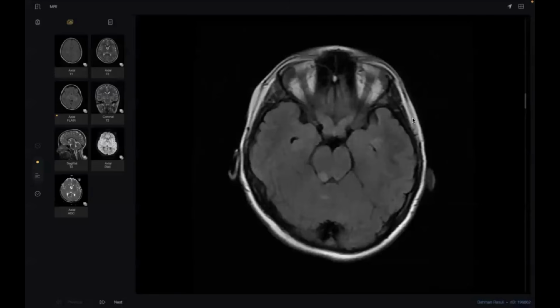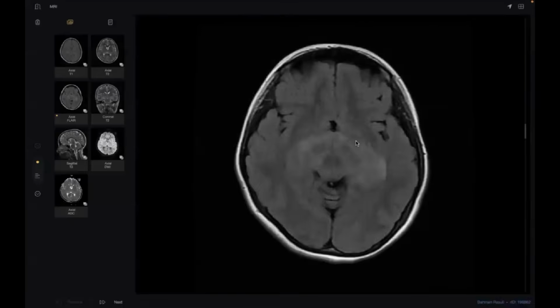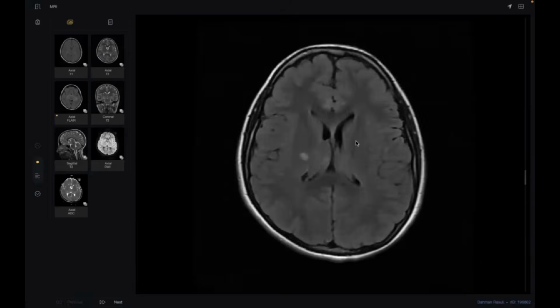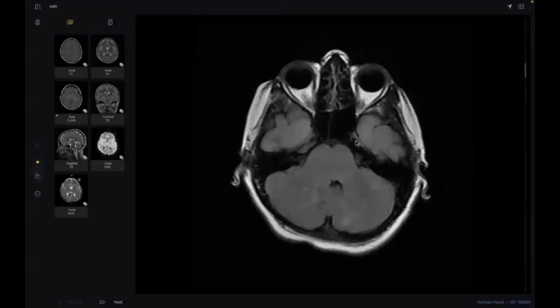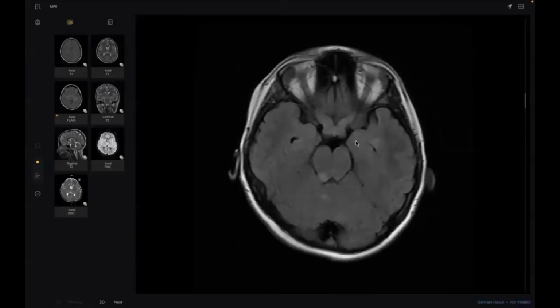These are multifocal hyperintense signals that may occur in a syndrome. What is the name of this syndrome? This is the most common phakomatosis. Yes, sir, NF1. Yes, excellent.